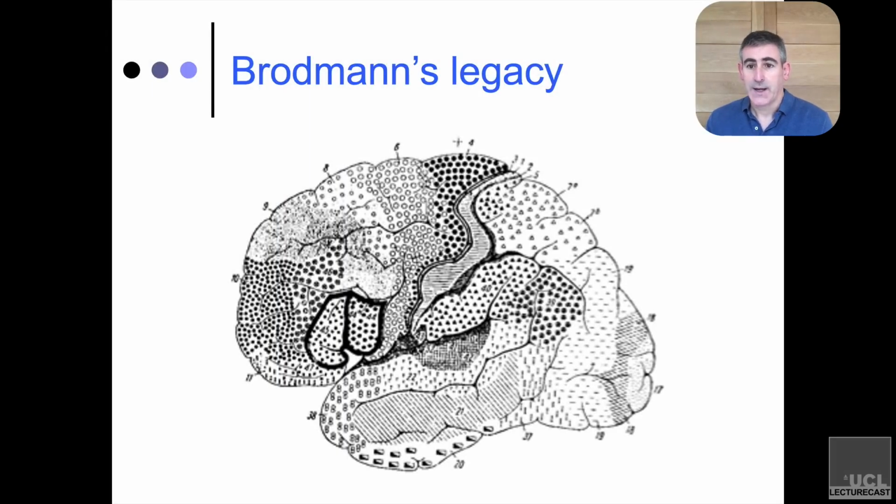And as I said, this is why. This is literally the image that they had to convert into their atlas. So if you like, you could look at this image and make as reasonable a guess as Talairach and Tournoux did. In fairness, they were neurosurgeons, so their neuroanatomy was probably better than yours. No offense. But nonetheless, this is all the information that they had to work with.